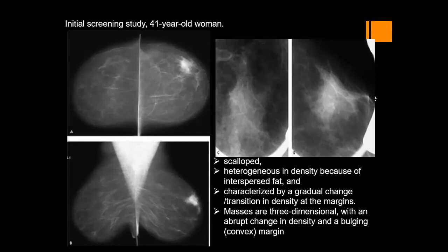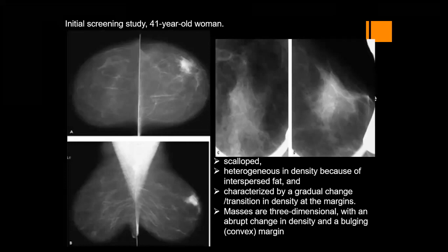Okay, so what are the differential diagnoses? What is your differential diagnosis? What could it be?